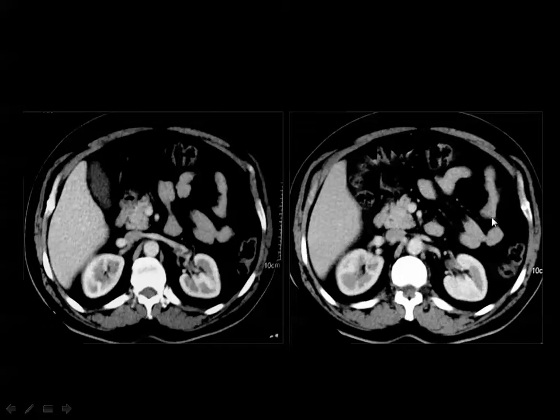And these are small bowel, and these are large bowel. This is the remaining part of the liver, this is the left kidney, and this is the right kidney. And you can see here, this is the left renal vein, which is crossing anterior to the aorta in order to join the IVC. Sometimes this renal vein may cross behind the aorta. This is known as retro-aortic renal vein. And this is one of the pieces of information which should be given in the report of a patient undergoing renal angiogram as a donor for renal transplant.